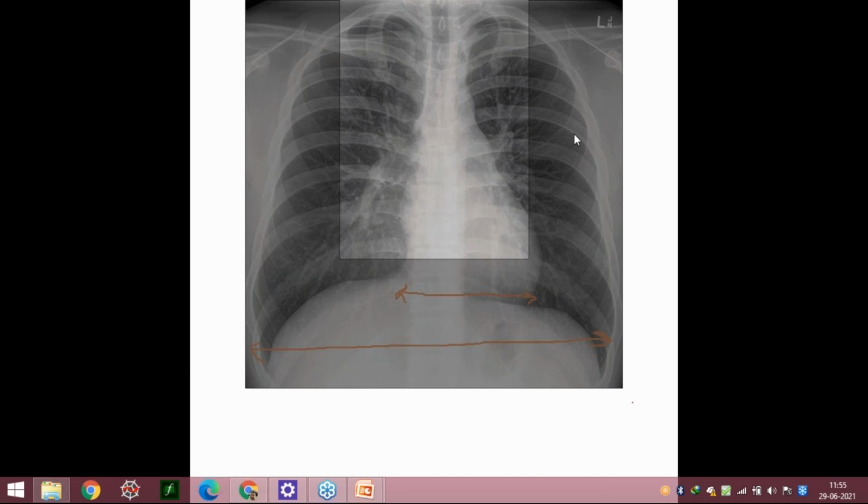In which condition do we know that there is, okay, we'll come to that, Swati. Between AP and PA view, I'll just tell you. What I was asking, in which condition are you expecting to see prominent vascular markings in the upper zone? Bat winging, CHF is one of the conditions. Anything else? Heart failure, okay, that is the same thing.